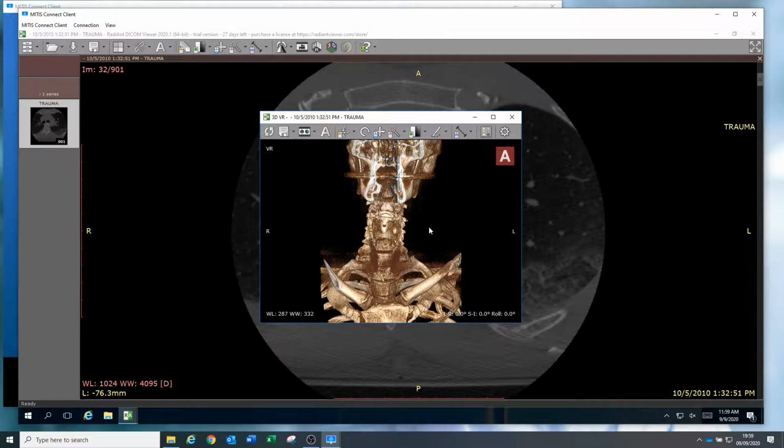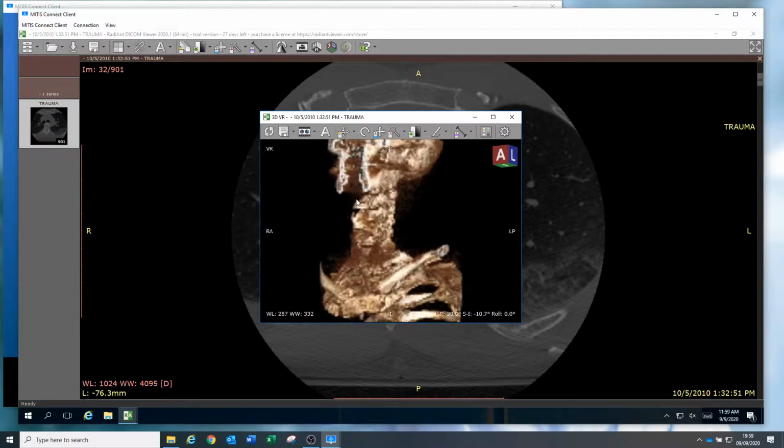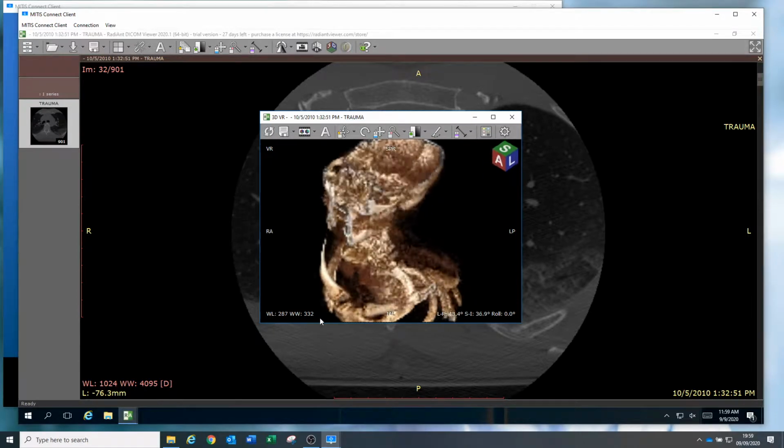By removing the lossless technology and the graphical engine, which is vGPU based from NVIDIA, we can now rotate the skeleton and see that the quality is poor, very pixelated, grainy and not of a good enough standard to report against.